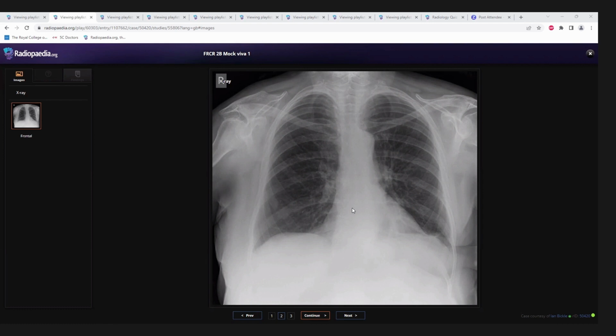Okay, there is an anterior rib. I can see 1, 2, 3, 4, 5, fifth ribs anteriorly. There is a discontinuity along its anterior part. So this may be a lytic lesion or fracture. I'd like to ask about the clinical data of the patient, if the patient is known to have a primary.